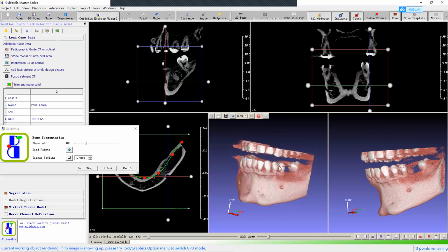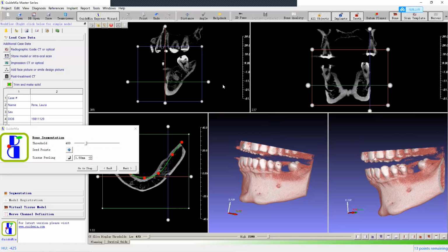What do you mean, you don't need the data? Okay, yeah, I know in Blue Sky Bio, you get rid of the information you don't need because it optimizes the program. I'm not sure what you mean. For us, on the cross-section views, we never reduce the data. We keep everything, for the purpose of safety, of maintaining all the data. On the 3D windows, we do cut. This is called the volume of interest. We only get the area we want.